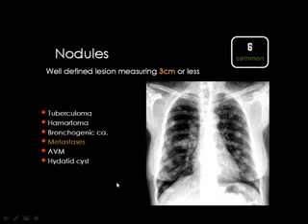In order to reach the differential diagnosis, we all know that metastases are usually multiple, and metastases are the most common multiple pulmonary lesion in the lung of the pediatric age and of the adult age. Then whenever you see multiple lesions like this, you diagnose metastasis as a first possibility.